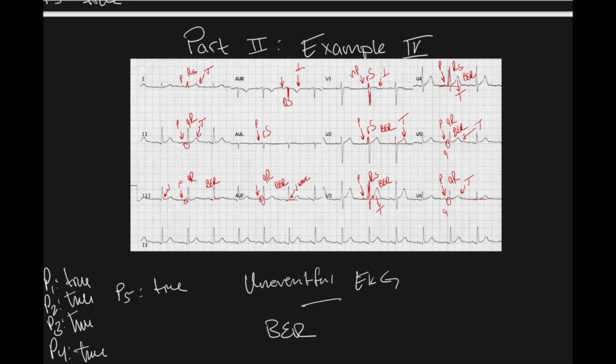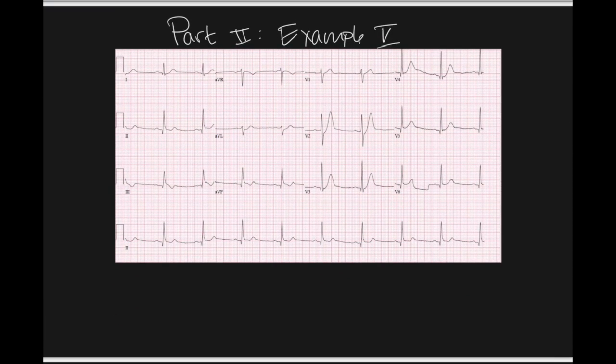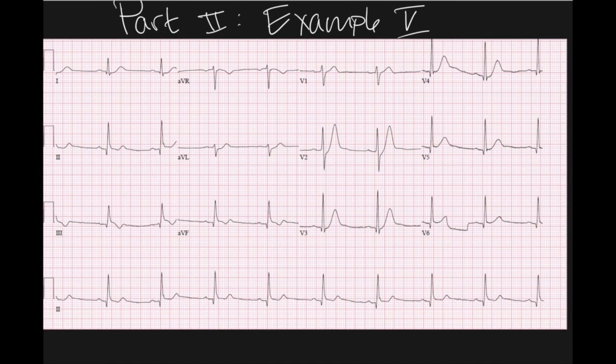Alright. Moving on to the next example. This one, I really would like you to take a moment, whether it's 10, 15 minutes, or however long it takes, and go through this 12 lead and see what you can find. So why don't you go ahead and pause the video. Here, if you want to pause the video, I'll zoom it in. And I'll see you guys when you finish.